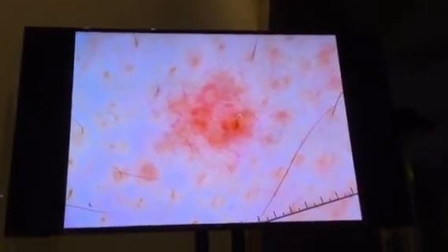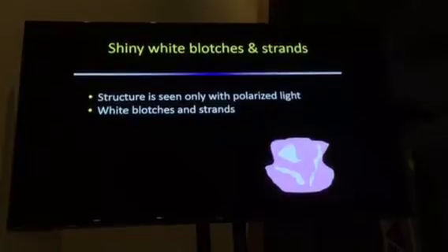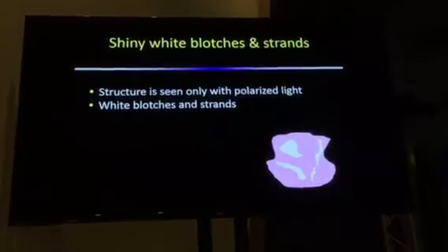Now, if you look at the studies that have examined this, the interobserver agreement, or the kappa, for this particular structure is approximately 0.07, suggesting that people really don't agree whether the structure is present or absent. Part of that is the limitation with the imaging, but I think also that it's a little bit hard to define.